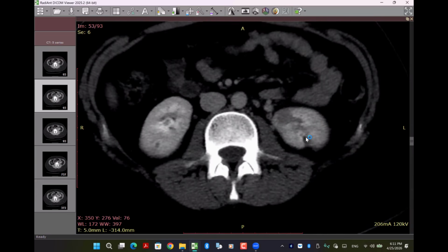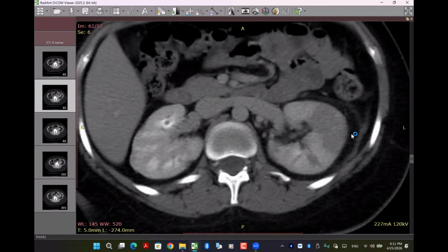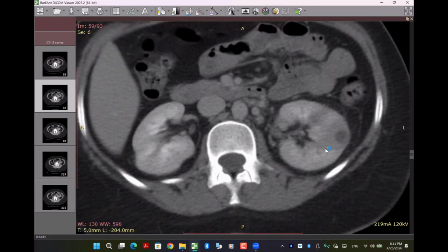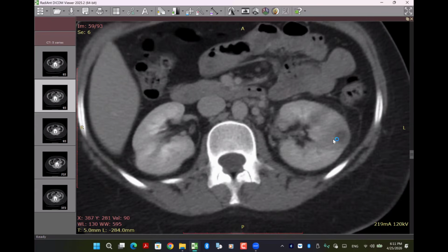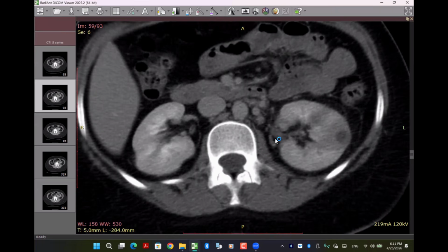So this is actually very similar to the previous case of infarction, but here there is some perinephric fat staining and mild thickening of Gerota's fascia as compared to the contralateral side. Exactly, and we give the diagnosis of this one as multifocal pyelonephritis in the left kidney with a small hypodense abscess formation, parenchymal abscess formation. Okay, for follow-up. But you did very well.